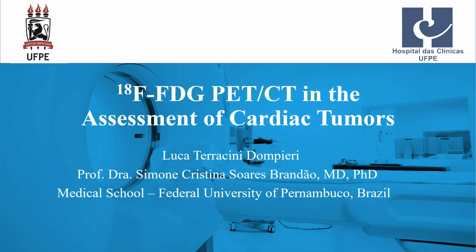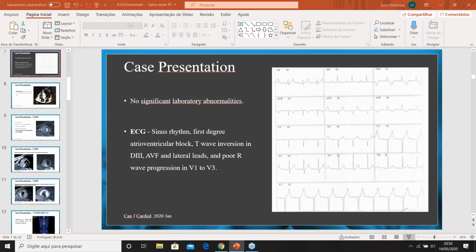I was very curious to understand the reason that it happened, because the fibroma had an uptake of almost 6.8, correct me. So what's the reason for that?